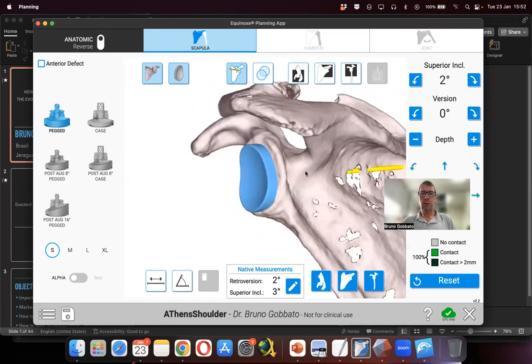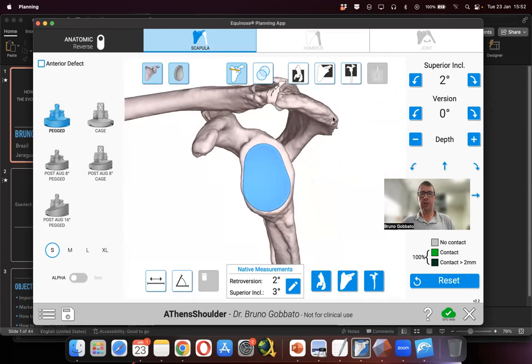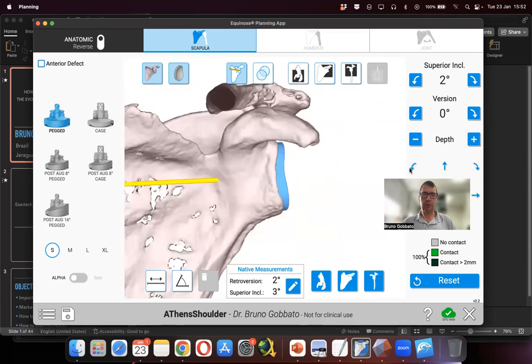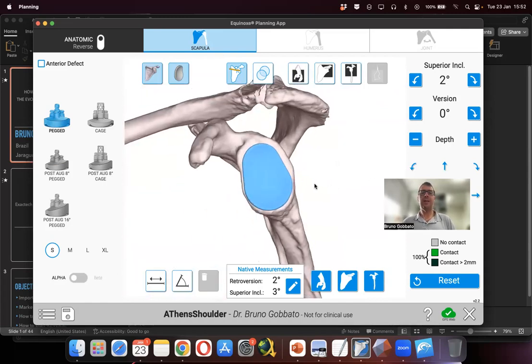Okay, so when I do that, I go to the surgery, I print some screenshots of this to make sure this is the correct position, to make sure this is what I aim for in the surgery. Principally when we have revisions or other cases that are more complicated. And this is very important to make sure we are choosing the correct implant for the patient and not going for reverse.